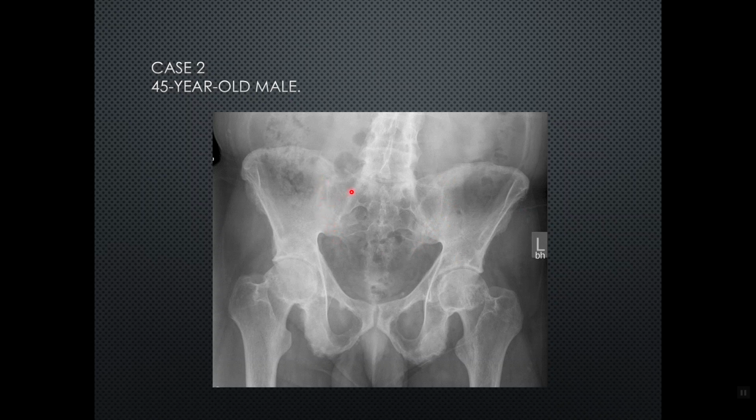In addition to that, you also see some changes in the hip. We know that ankylosing spondylitis affects your root joints. It primarily spares your distal sites, hands and feet, but it certainly targets your root joints. In other words, root joints are the hips and shoulders. Typically you see uniform joint space narrowing, bilateral. You can also see some proliferation or whiskering, basically what we call enthesitis at the insertion of the capsule around the hip. Typically there's a collar-like proliferation of bone, and that's very characteristic of AS affecting the hips.